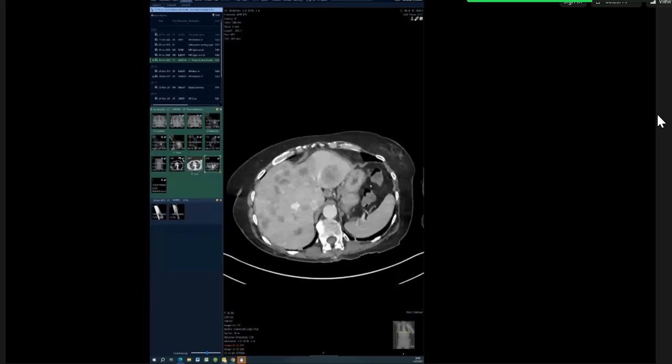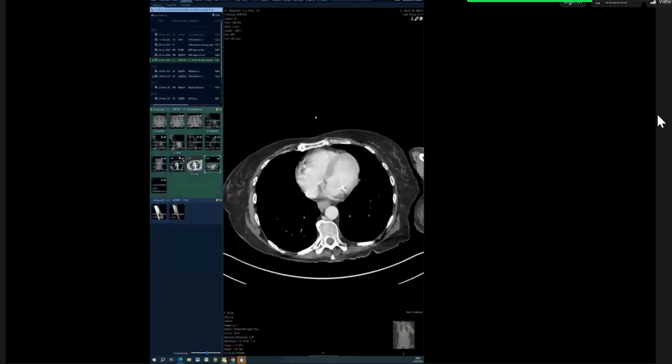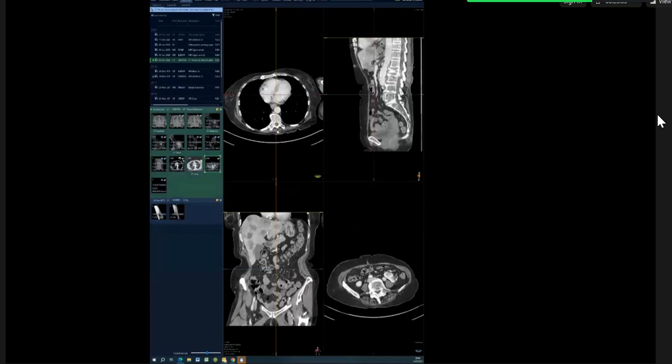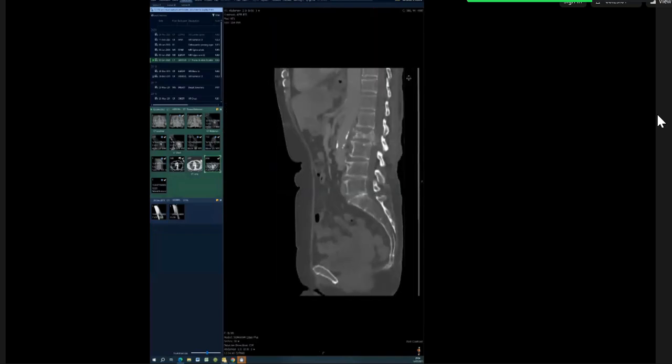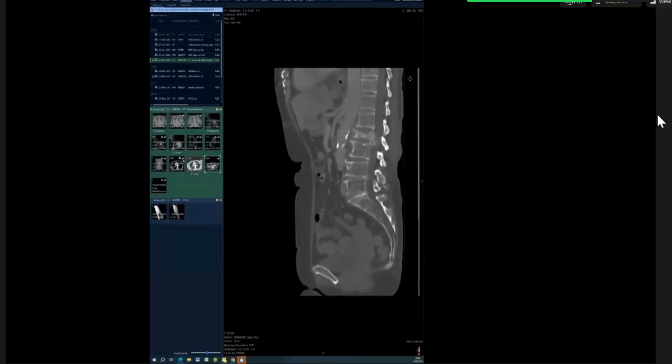You've picked one bone lesion. You forgot to say that I'm going to look for bone metastasis as well, because nobody's going to die from a pathological arm fracture, but they will get paralyzed from a metastatic spine. So this one here, you should be talking about, or if you can't pick it, you should say it out loud: I would like to exclude further bone metastasis.